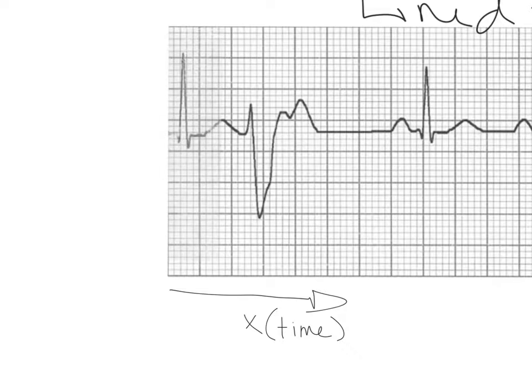Whether it be in seconds or milliseconds, okay? Now, for me, guys, I'm going to be honest with you. I do all my measurements in seconds. That's just what I'm used to, okay? You might see me once in a while talk about milliseconds. You'll probably see it in the book as milliseconds, all right? But as far as I'm concerned, I think seconds are going to be what's most commonly used here, okay? It's going to be a measure in seconds.